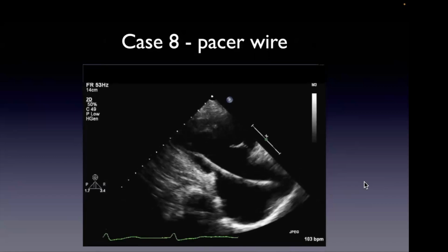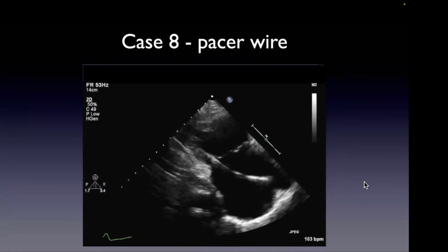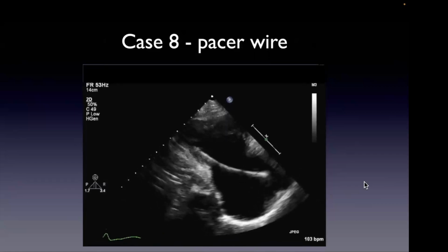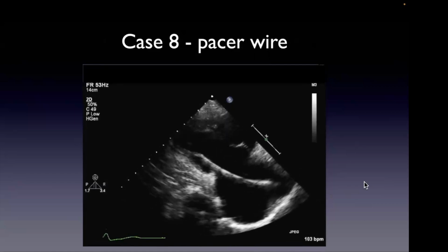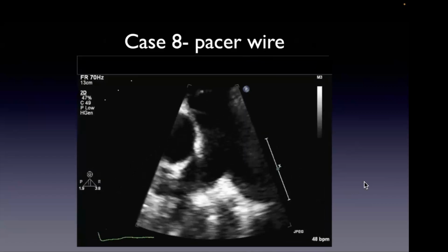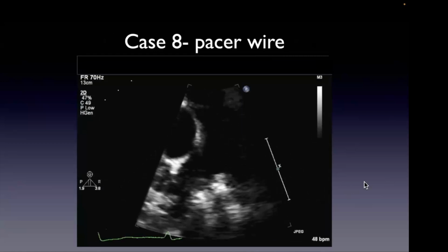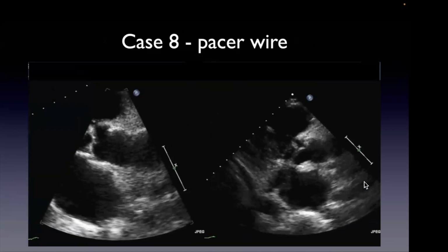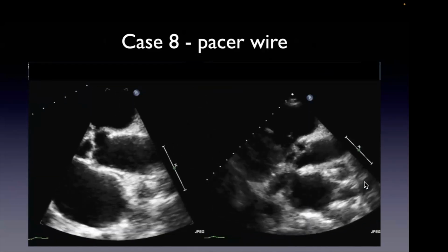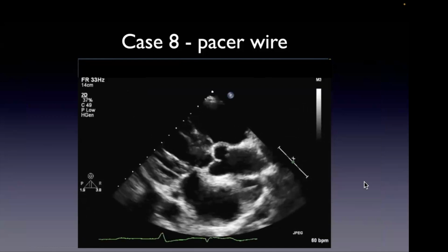So what's this? It's like a pacer wire. Yeah. And so the question was, has the pacer wire migrated into the RPA? There's a bifurcation. See it there.